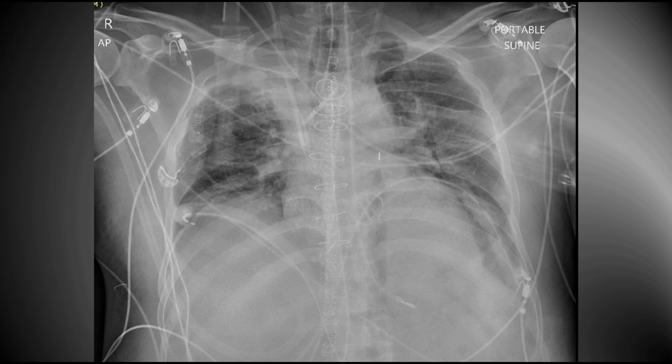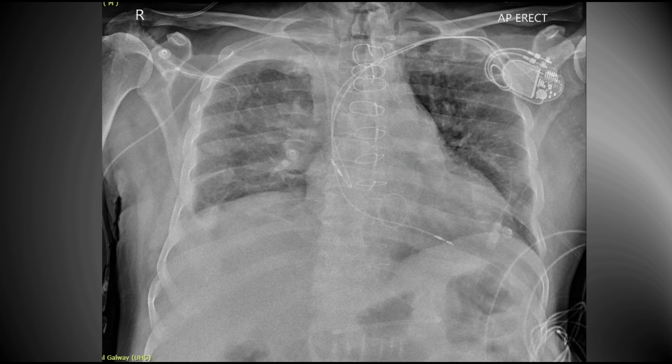Len goes for a mitral valve replacement, and this is his post-operative chest x-ray. Can you identify the lines and the tubes? So there are a couple of central lines. There's an endotracheal tube, there's the sternal wires, there's a couple of chest drains. There's one other line that you need to take note of, and that's this. The intra-aortic balloon pump. Four weeks later, Len has a permanent pacemaker and a difficult to see tracheostomy.